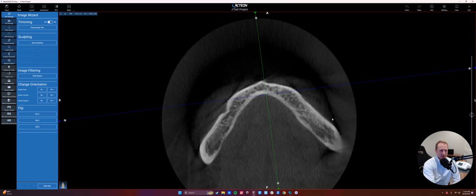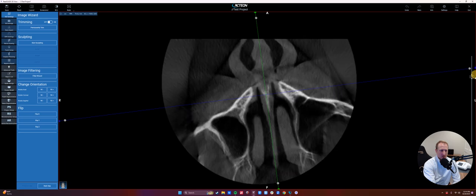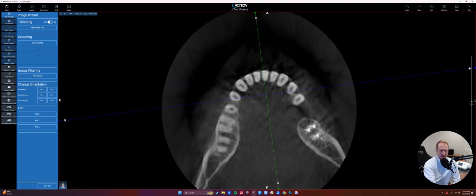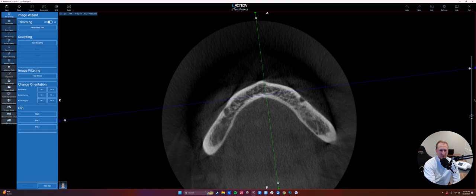Okay, and so that can be our initial read. And you can do this pretty quickly when you get comfortable. Okay, so we're going pretty quickly. We're looking for any abscesses that pop up. There's some caries. We see an edentulous site. We can see the mental foramen and where it pops out there, right? So here's our mental foramen on this view.